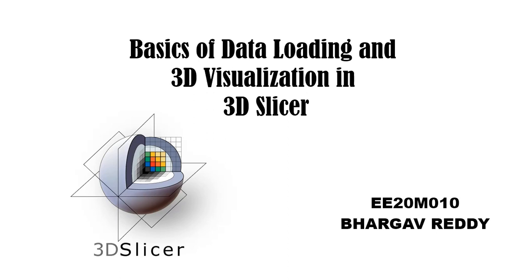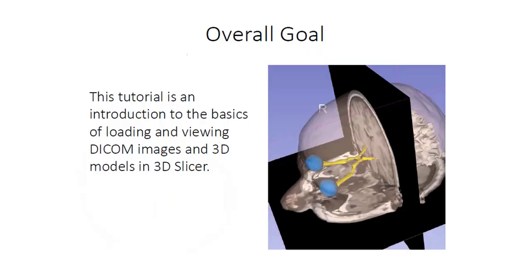Welcome to my demonstration on basics of data loading and 3D visualization in 3D Slicer. This video is done as an assignment for medical imaging course at IIT Tirupati.